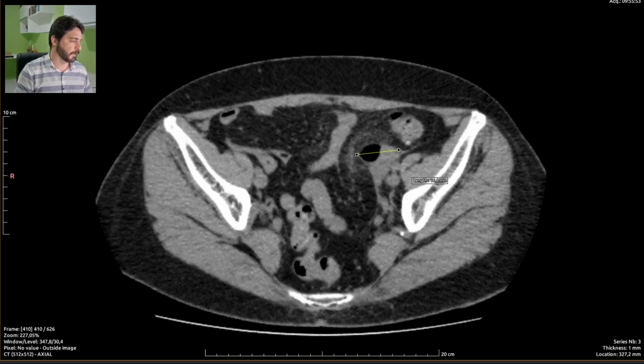So, yep, and this is it. Another one bites the dust. Let's sign it off, clear the cache, and get an easy one now, a head CT scan. Let's go for a head CT scan.